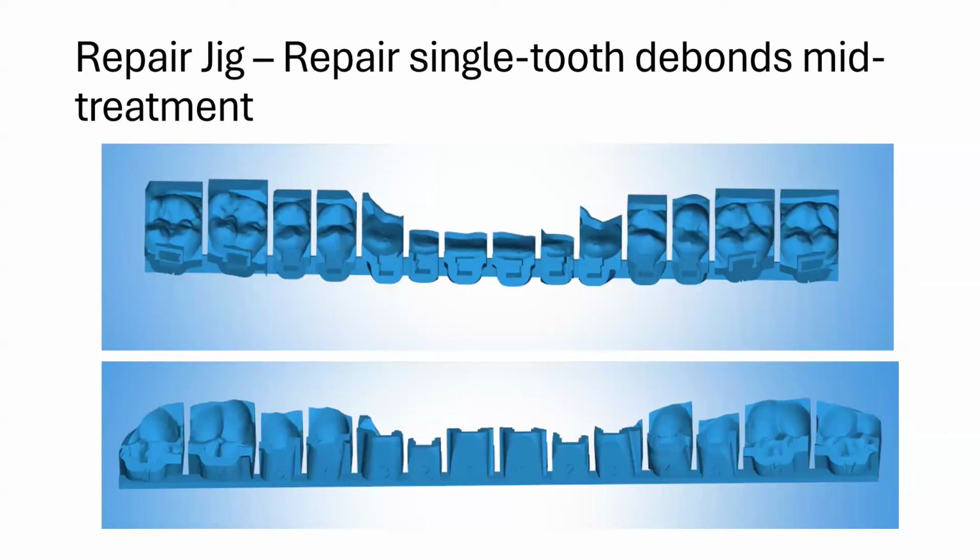And the software sometimes will start to misrepresent the anatomy of the root as you go subgingival. What I found is if you hold that shift key and you customize the base a little bit, it will stop trying to adapt to what it's predicting the subgingival anatomy to be, and you can go subgingival much more predictably. Most of the wedging, though, is wedged so that the contact point is at the subgingival point, and the wider part of the wedge is at the incisal point. I think that helps as well.